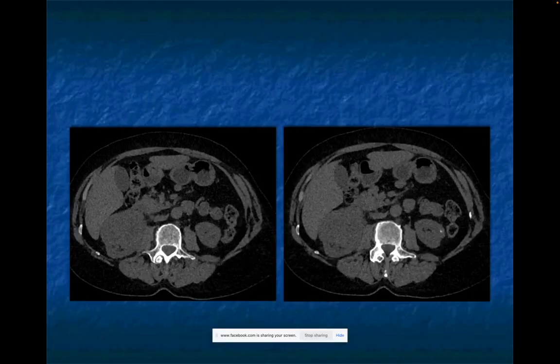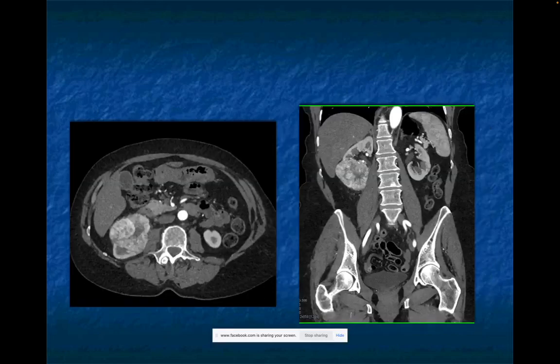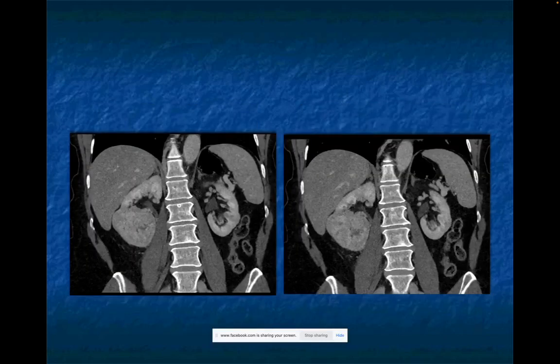Okay, kidney. Let me just go and finish up. I know my time is running short here. Patient has a right renal mass. Okay, renal cell, next case. Very vascular. Has maybe a scar. So maybe I'm thinking, could this be an oncocytoma? You can get a sestamibi scan to prove that. It may be important because if it's an oncocytoma, you do a partial nephrectomy. If it was a renal cell, it may be a tough case for a partial.